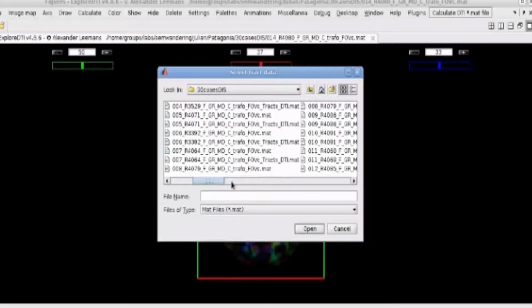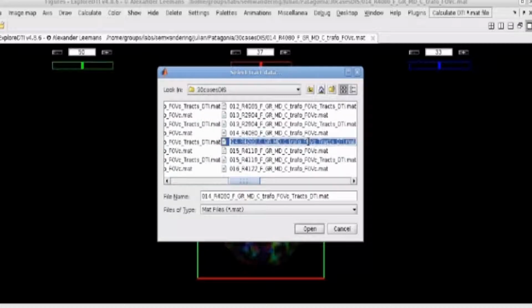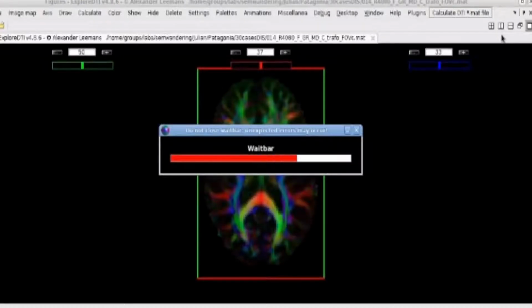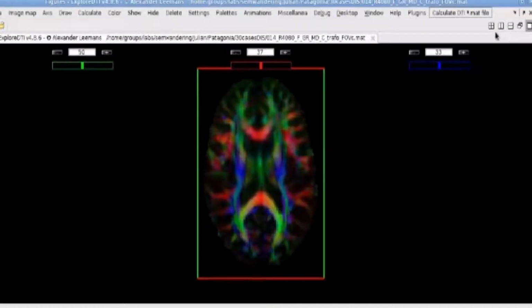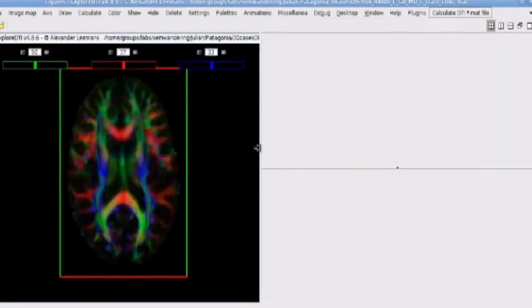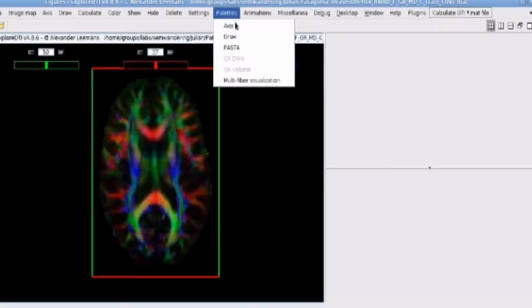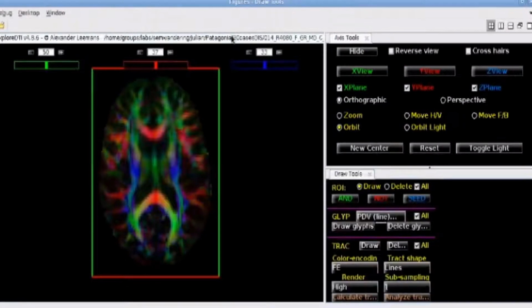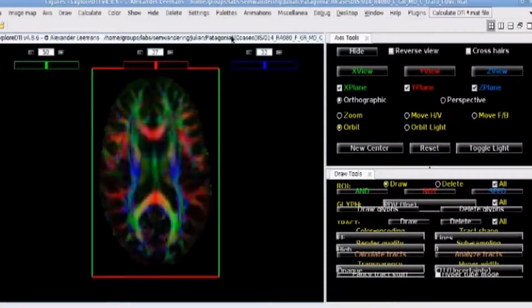Hello, my name is Julian Marino Davalos. I am in the Department of Psychology and Neuroimaging, and I will present you the tractography with cases acquired in 2016 with diffusion tensor imaging. Then, what we are looking at is the bundles in the central nervous system.